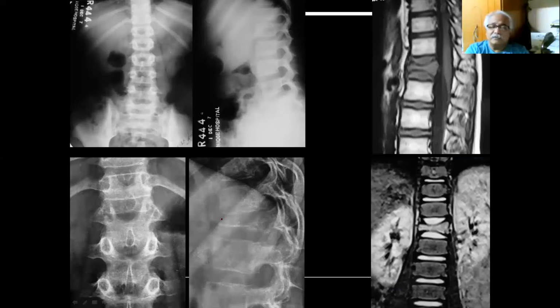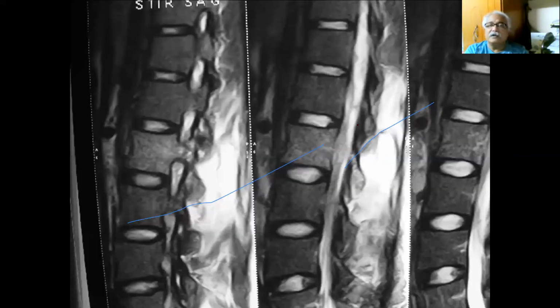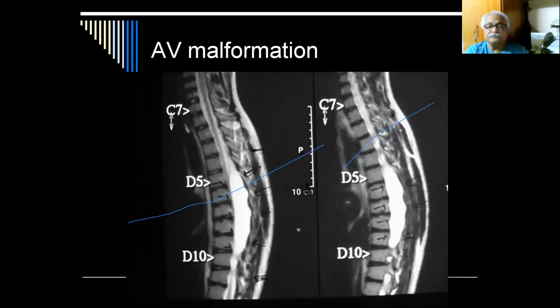This is the vertebra. If you see like this, you can see this sort of compression fracture. Sometimes you can see the epidural abscess, it will follow like this, and like this you can follow and see the epidural abscess. Okay, like this one. AV malformation, sometimes we don't see that much, because I'm not very keen on doing spine surgery nowadays. So you can sometimes see AV malformations.